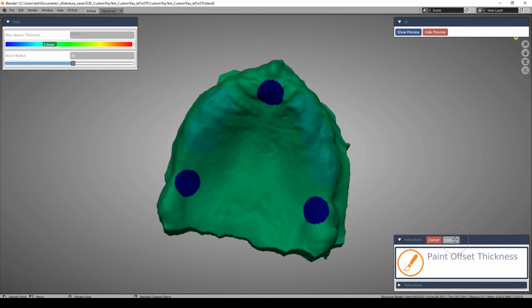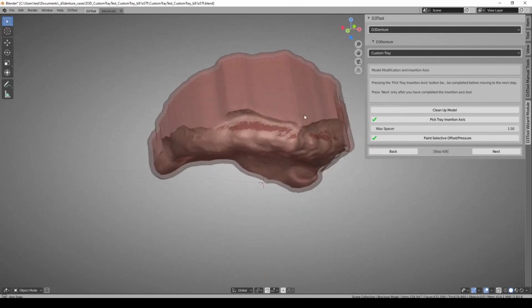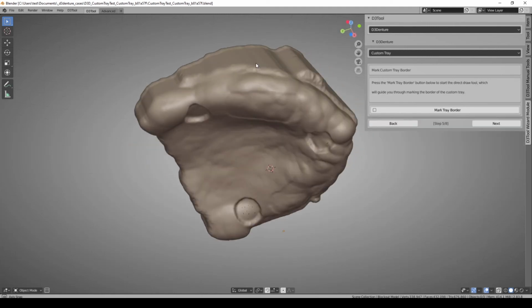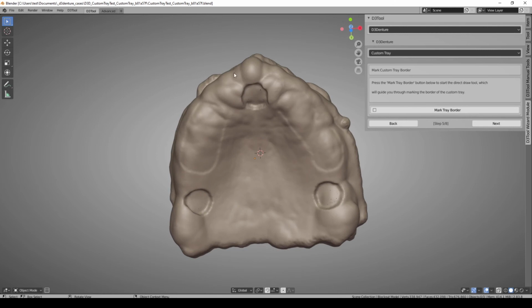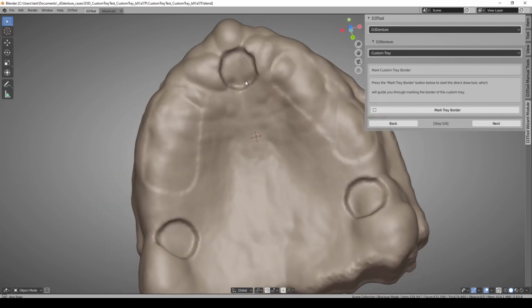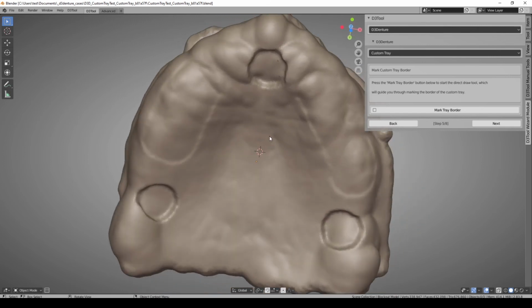And go commit. So it should be basically 3 stops and an area that's a little bit less thin than the rest. Looking good? I'm going to hit next. And that's exactly what we see here. It looks like those areas that I painted that were below the middle range just have a slight indent. And then the areas where I wanted complete stops, those are fully depressed in.